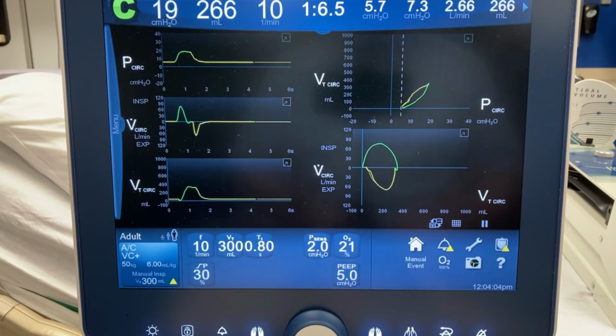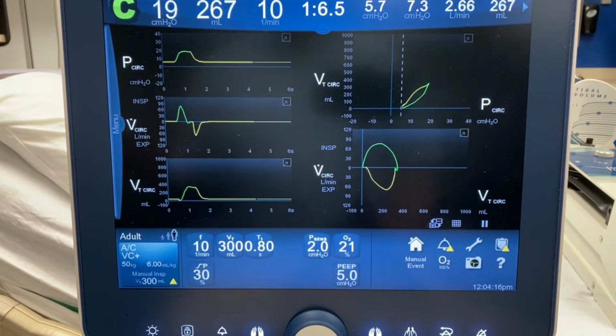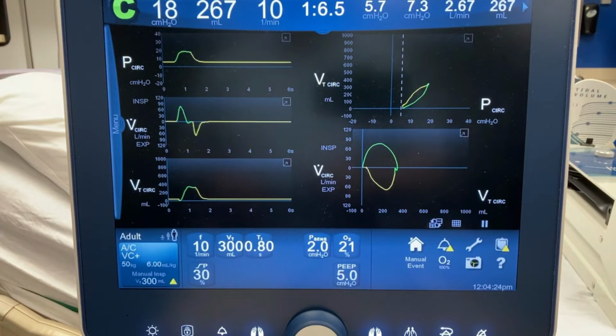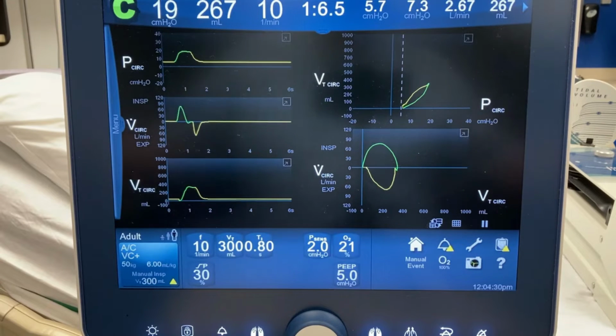Okay, I'm gonna try to create some scenarios here for you of things that you might see in the hospital on a ventilator with a patient. I'm gonna try to create these as best I can. I don't have a real lung, and nor do I have a sick lung. Actually, what I have is a test lung, spring and bellows, as my person that the vent is attached to. But it is a big cavernous bellows.